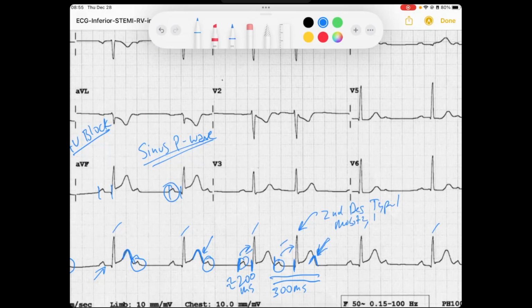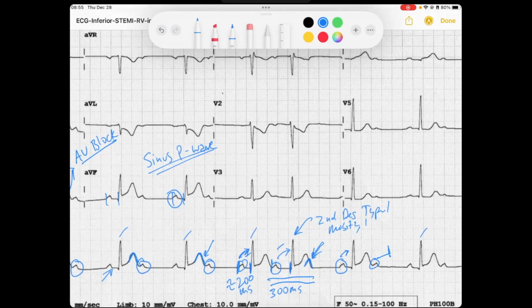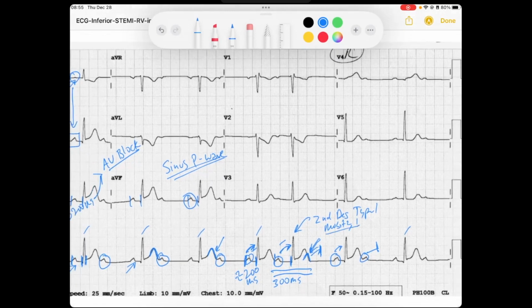And so the AV block, though, sometimes it'll conduct once and then it'll block. Other times it'll conduct, and then block. So this Mobitz 1 is, sometimes it is conducting in a 2-to-1 fashion, meaning that you have 2 P waves for 1 QRS. And then in this group, there's conducting in a 3-to-2 fashion. So there's variable conduction. So, okay, so that's our AV node function.